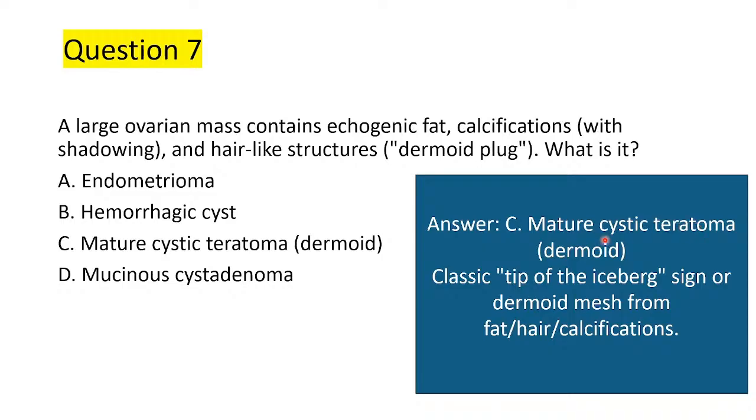Mature cystic teratoma, dermoid. The classic tip of the iceberg sign, or dermoid mesh, arises from fat, hair, or calcifications.